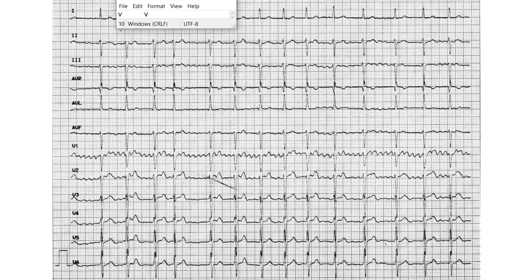So again, I'm just going to be using this to check if it's regular or not, and we're just scanning through it, and we see here already there's something here. And here, to be honest, it looks very similar to the rest of the beats, so it's unlikely to be an extrasystole. The other point to highlight here is that, again, don't be blind, look around. Also keep your focus especially on V1. Lead 2 and V1 are the most informative about these two points, the second point and the fourth point, of rhythm and of the P wave or F waves.